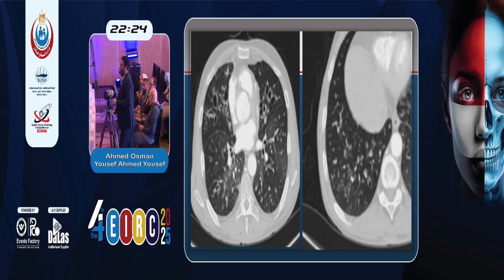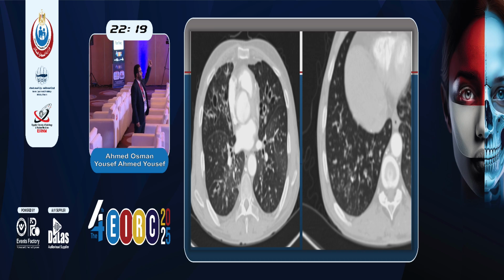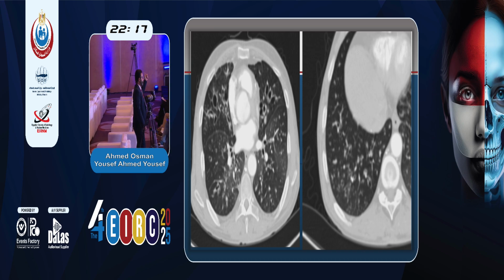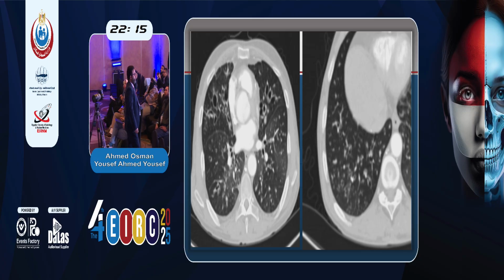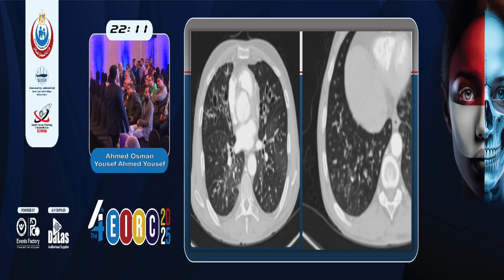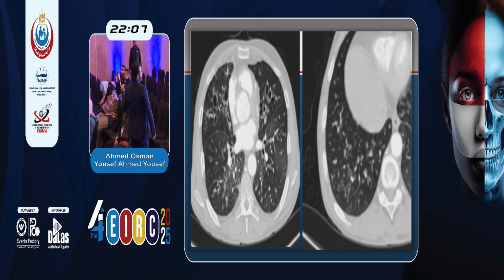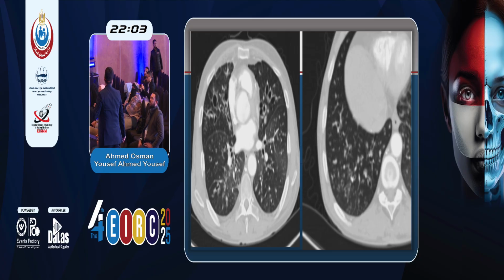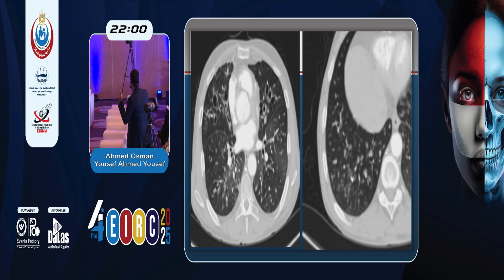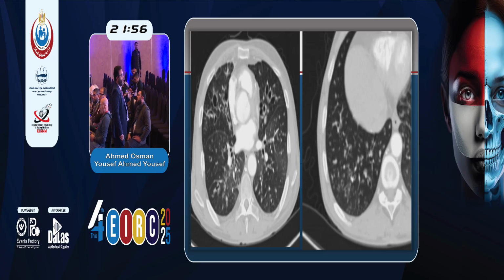Regarding the ground glass, this may be an activity of the disease or a site of hemoptysis, and this may be very important if the patient is going to interventional treatment, if the hemoptysis is life-threatening. The ground glass may alarm us that these may be the sites of hemorrhage.